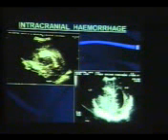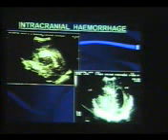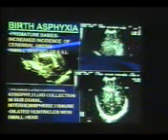ventricles, seen here, and this is a big intracerebral hemorrhage you can see here. This is a parietal hemorrhage we are seeing. This is a gross hemorrhage in the ventricles, and this is a big hemorrhage in the parietes.